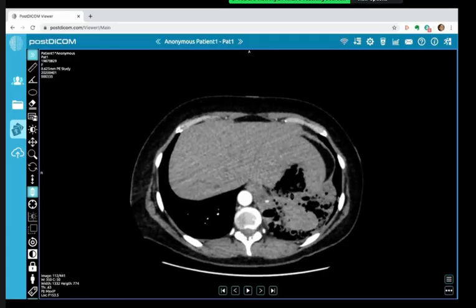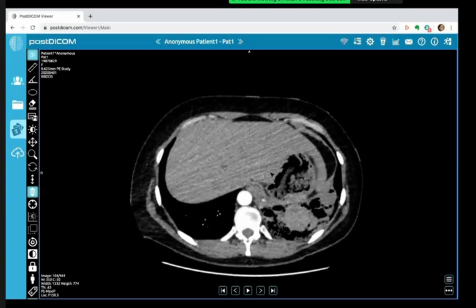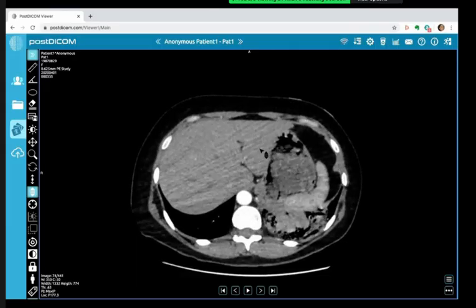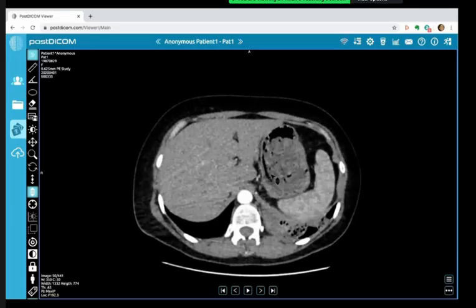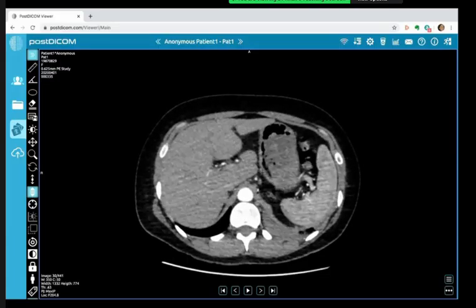Okay. Yeah. So expect tortuous. Yeah. But I imagine that it's going to get to the aorta, maybe. Let's see. Okay, can you still see it? Yeah. Yeah. Yeah. So it's still going.